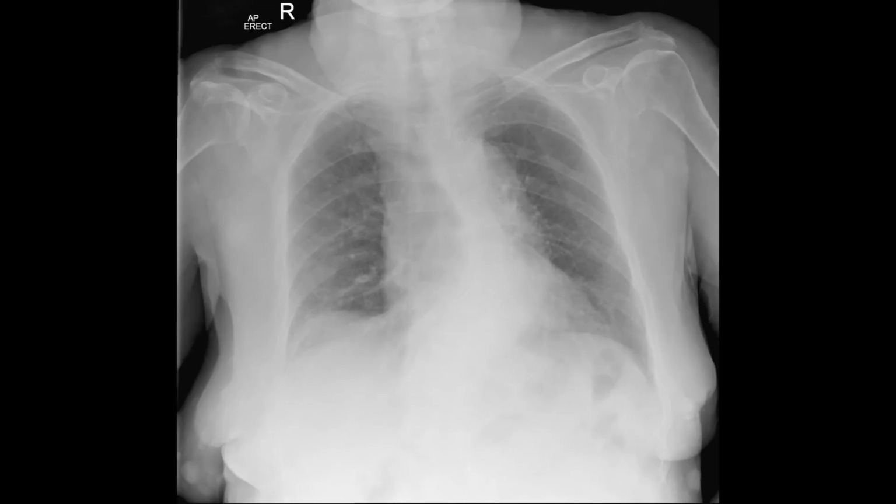If patients have skin lesions, they can often be projected over the lung fields. There is one small nodule projected over that lung field, but it's more likely that because the patient has multiple neurofibromas, that this is going to be a neurofibroma. The problem with the chest x-ray is you cannot be exact about this, you can only give a probability.